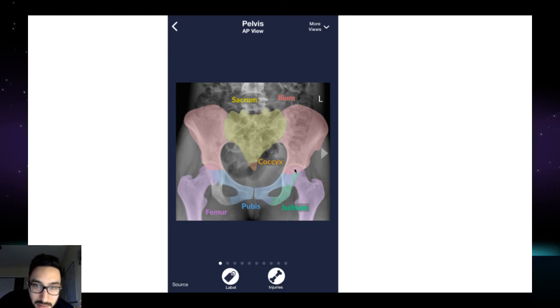You also have your acetabulum, which holds your femoral head, and there's your femur bilaterally. So there's your basic anatomic landmarks of your AP pelvis that you should be looking at and making sure that they're intact. Specifically, we're going to go through a nice systematic approach of how to look at all these parts and make sure things aren't abnormal.